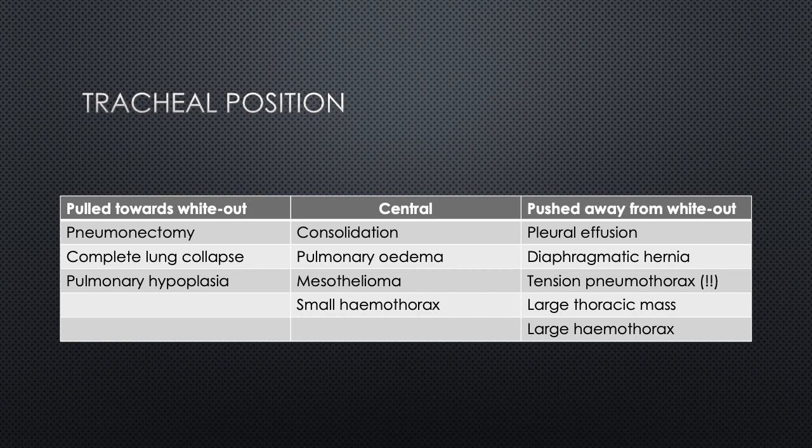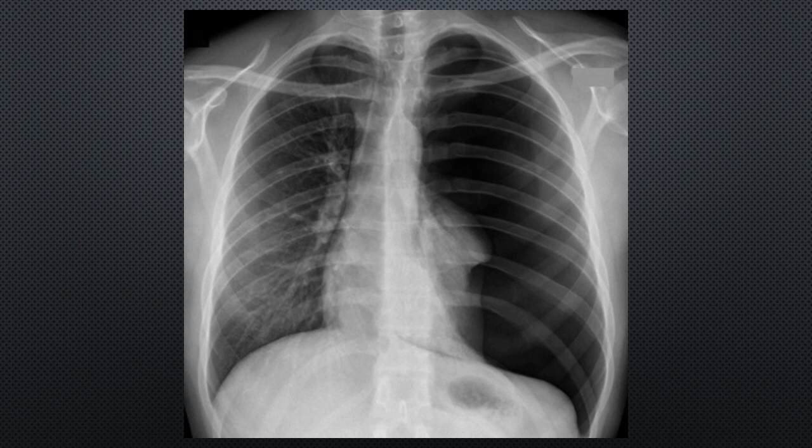And so the next image will show you what I mean. So this is a left-sided tension pneumothorax, as you can see it here. You can see the left hemidiaphragm is actually depressed. Compared to this side, it's lower. There's a step in it and it's coming down.